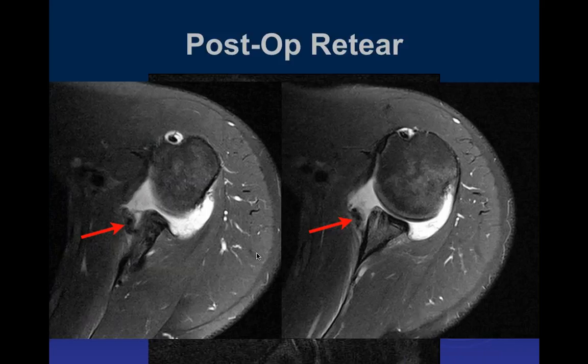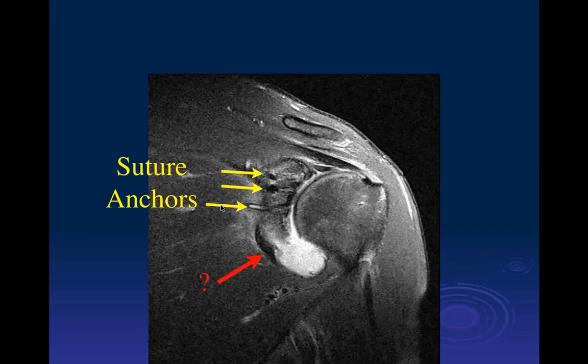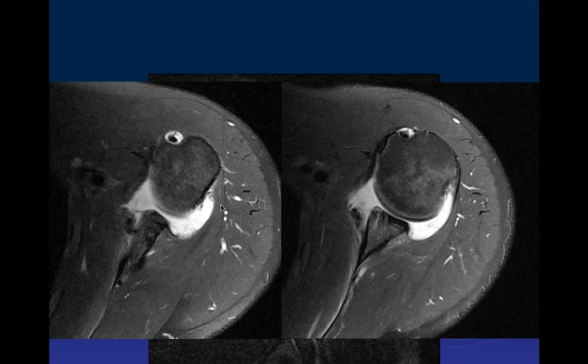Okay. The surgery, the anchor is in the wrong place, it seems, and they missed a boat in repairing this. It seems they're too far superior, and this is more of an inferior kind of lesion. So the anchors are, well, I don't know what they repaired, but they didn't repair the problem.